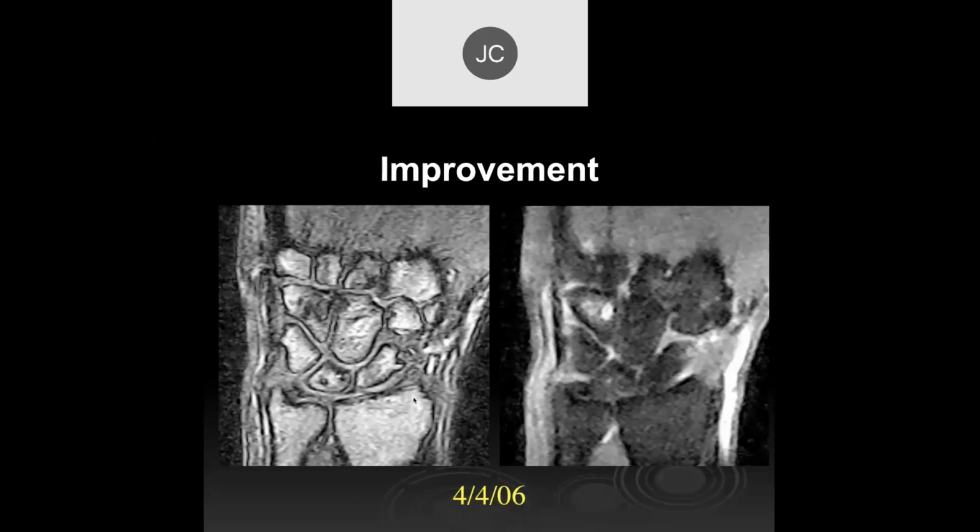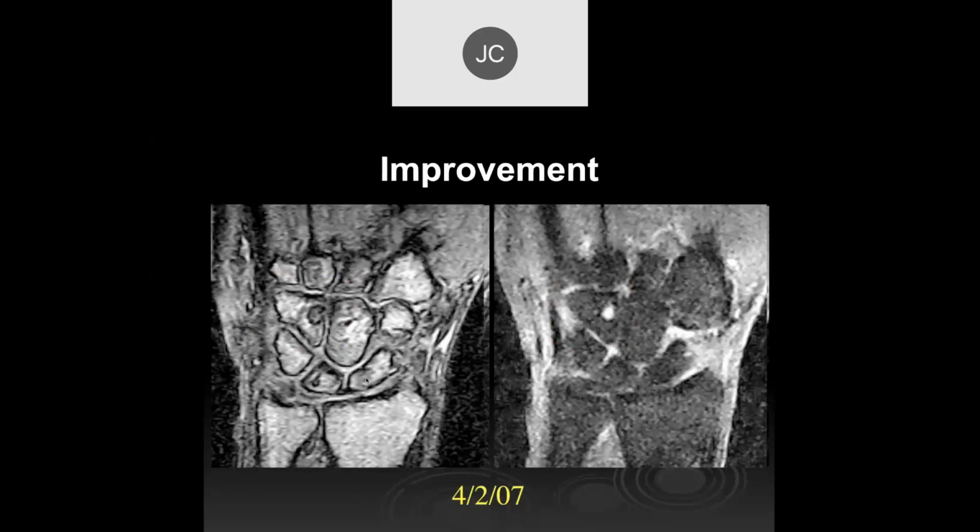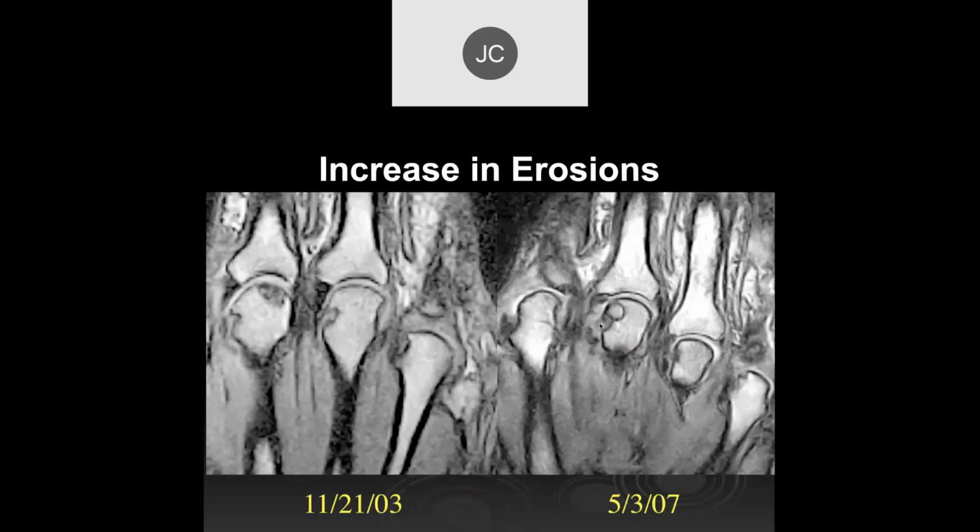Yeah. And here's 4/4/2006. And then here we can see after putting on treatment, the erosion is much smaller. The inflammatory disease is much smaller, and you're left with a much smaller erosion than you saw in the original study.